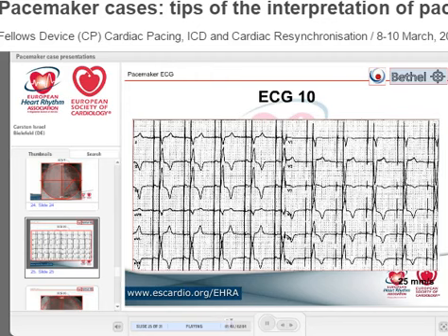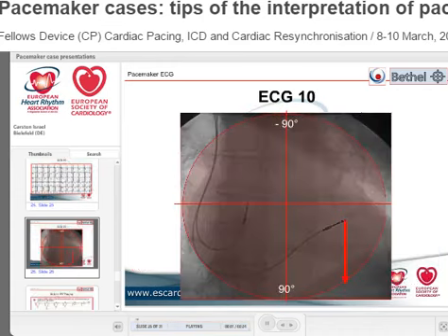Harimon says you are always in the septum. Unfortunately, I think this is not entirely true, but it's a very nice fairy tale, so I like also to tell it. It's a specific situation, and you see that the paced QRS is just 140 maybe. So I think here we are in the right ventricular outflow tract. This is the lead. It may be even near to the right bundle or anything, because the QRS is more narrow than in other situations. And that is my favorite lead. I implant almost always there because I have the feeling maybe it's helpful for synchrony. But again, you typically have an axis in the direction of 60 to 90 degrees, which is normal axis.